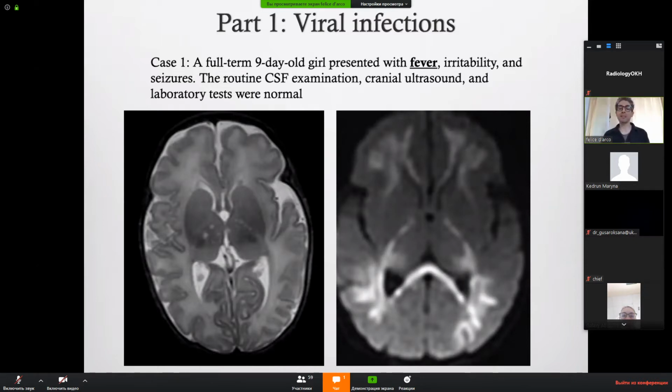And the distribution of these areas of abnormalities is along the deep medullary veins territories, with what we call prewallerian degeneration of the fibers of the forceps major. Prewallerian degeneration means basically a degeneration along the fibers when the territory involved is this. So basically the degeneration follows the normal fiber anatomy downwards.